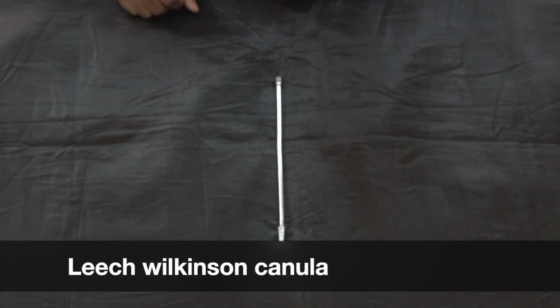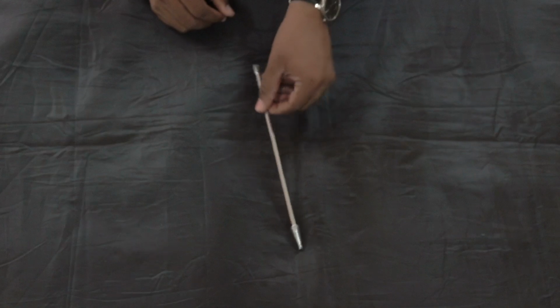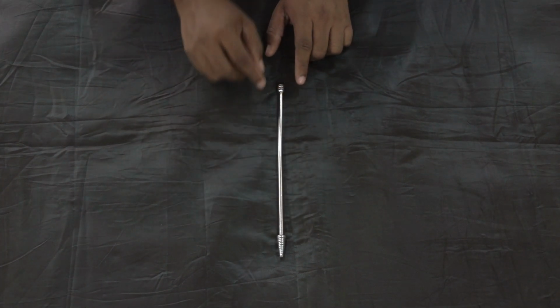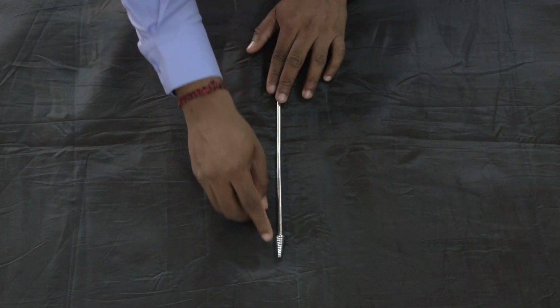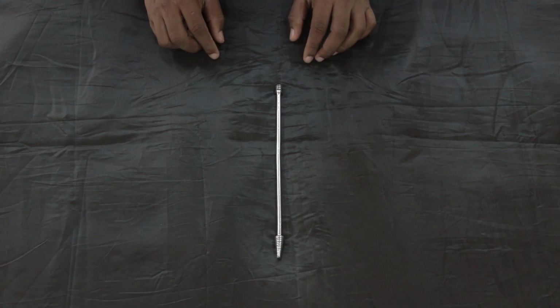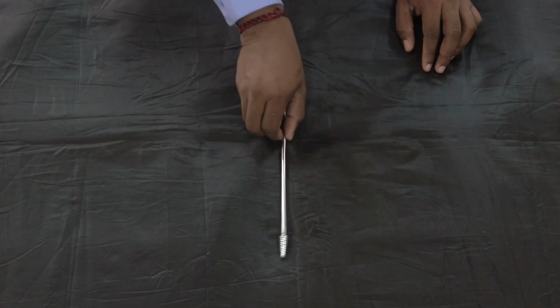This is Leech-Wilkinson cannula. It's a cannula which is used to inject the dye through the cervix into the uterine cavity to assess the tubal patency in the hysterosalpingogram. So it has a long shaft and the cannula end, where we fix the contrast medium, and this pyramidal shape is specially designed to fit into the cervical os. This is called Wilkinson cannula.